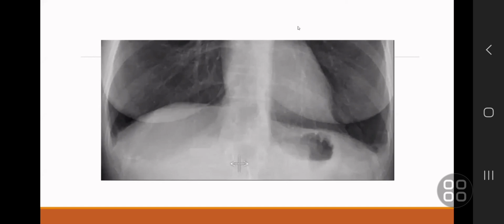So please continue. Okay. So I think this is the next slide from that hidden areas one. This is just clearly showing the lung, the lower lobes extending behind the diaphragms, and the need to identify that. I have a few viva slides after this, and we'll try to get through them quickly so we can move on to the next section.